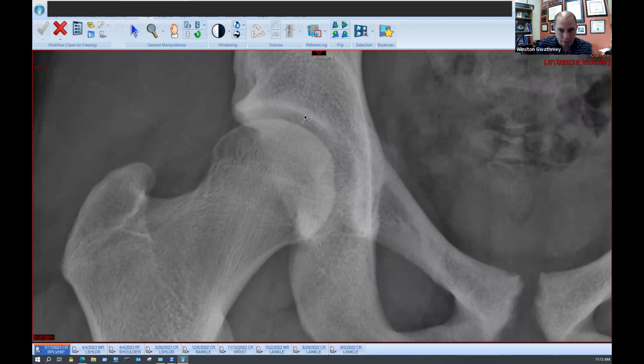So the sourcil is a weight-bearing dome. In this circumstance, if you follow the actual lateral edge of the pelvis, you can get a sense that this line right here would reference the anterior inferior iliac spine. And so you can get a sense of three different lines here: the posterior wall, the anterior wall, and the anterior inferior iliac spine. If you're looking for that on a pelvis model, this is the AIIS. Sometimes you can see that it can overshadow the anterior wall, so you want to make sure you understand what the morphology is.